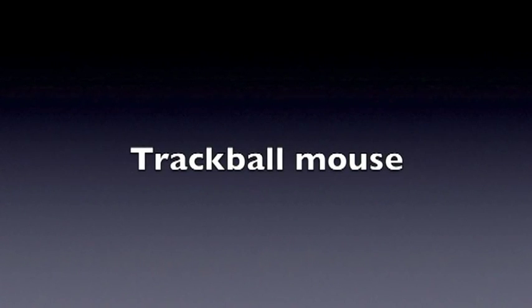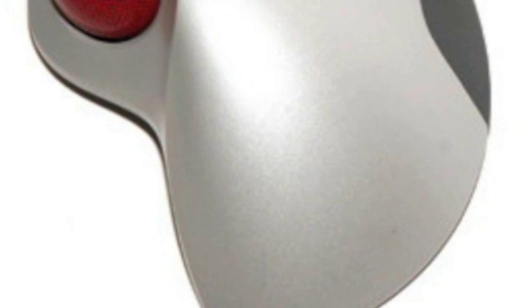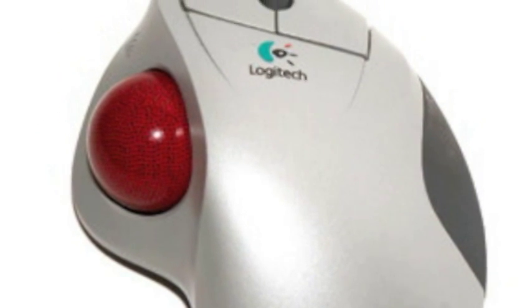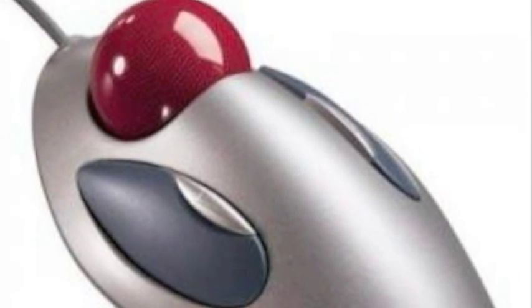The trackball was originally created by and for the general population. However, it has been found to be very helpful for individuals with disabilities who are having difficulty using a standard mouse due to pain, lack of range of motion, strength, and dexterity. The two trackball mice that we will be talking about in this video are the thumb trackball mouse and the index trackball mouse.